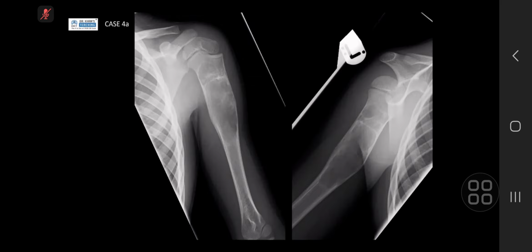So again, any other ideas? If this is in your A&E emergency department, plain film reporting pile, and a patient presents with a fall, what would you be suggesting? Would you be suggesting anything? I would further refer the patient for cross-sectional imaging. Okay. Can you think of any other conditions that occur?